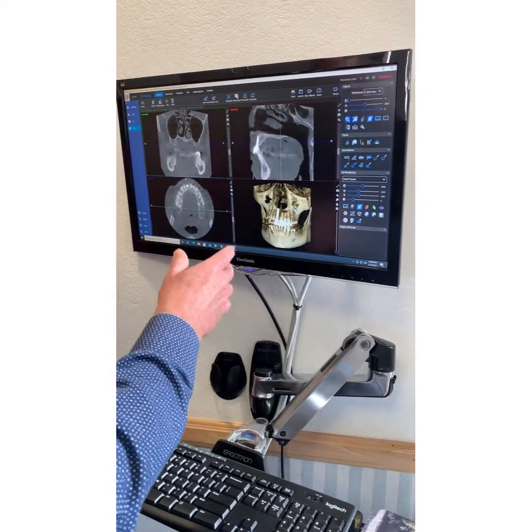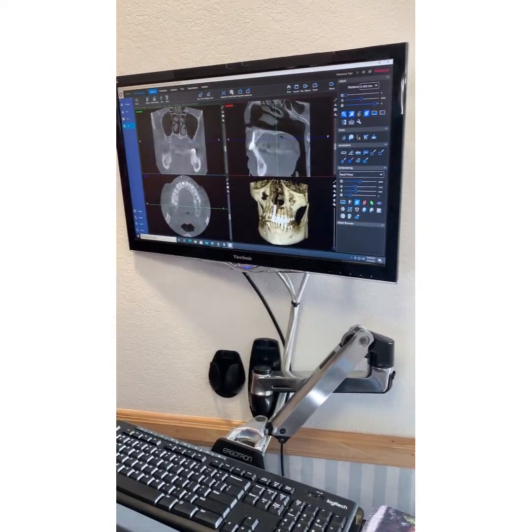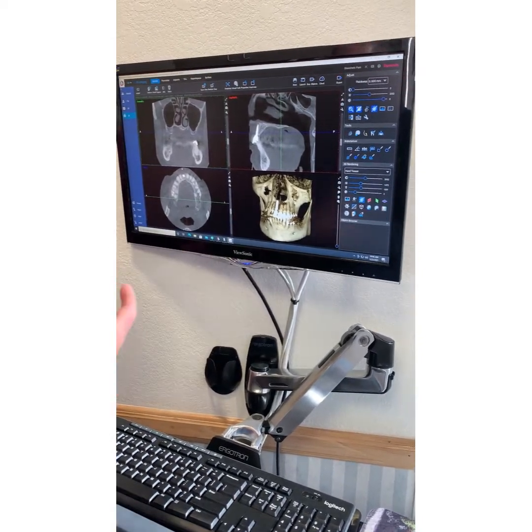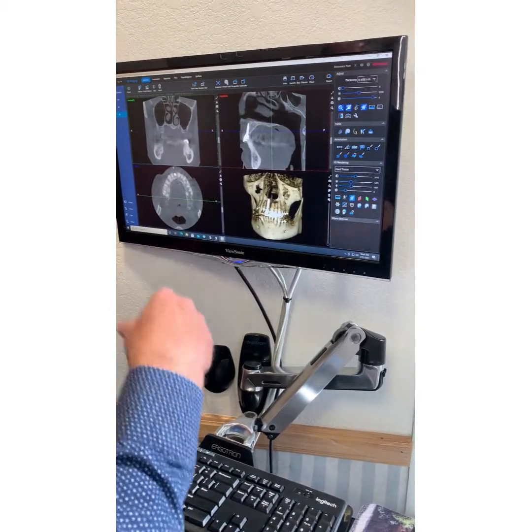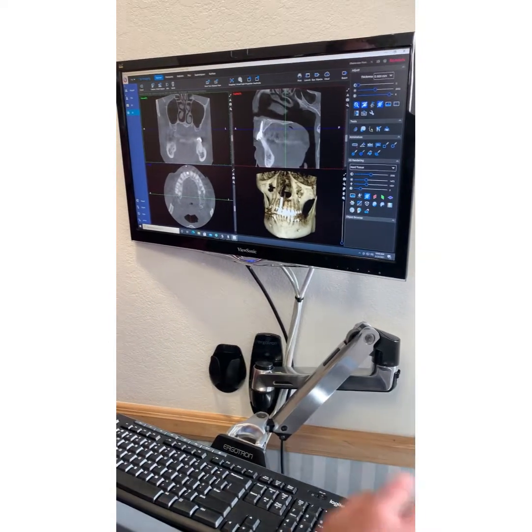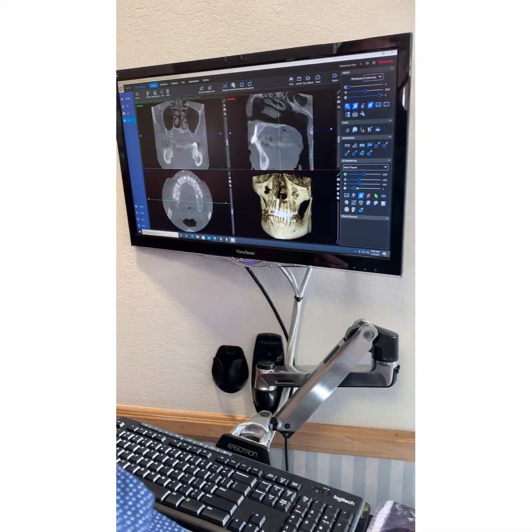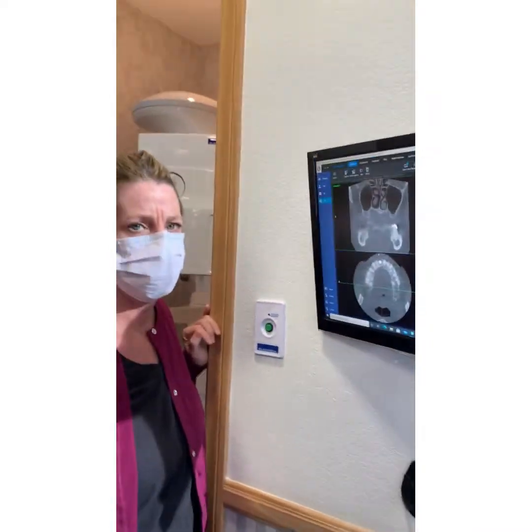It depends. This is so subjective. This is for case presentations for the patient rather than for diagnostic reasons. There's a guy back east that always sends me the volume and it looks like he came from a Grateful Dead concert. He tie-dyes it all up, and it's however you want to see it. So this is sliced in half? It's X, Y, and Z plane. This way, and this way.